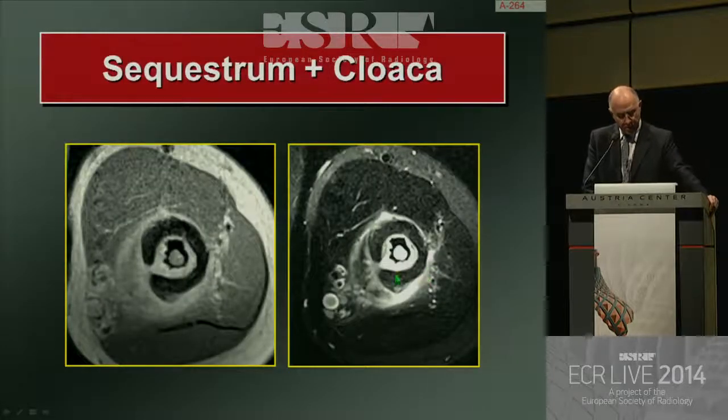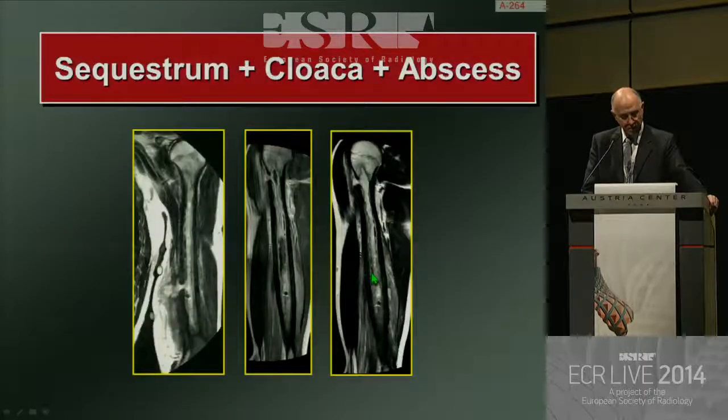Not surprisingly, the soft tissues can be edematous around the bone, but you can also have space occupation close toward the cloaca. Why? Because you have abscess formation and a very thick fibrous proliferation coat. And you can identify these in follow-up. There's the cloaca here, allowing the pus to go through, forming an abscess, and the thick fibrous proliferative coat overlying it, and another place here as well.